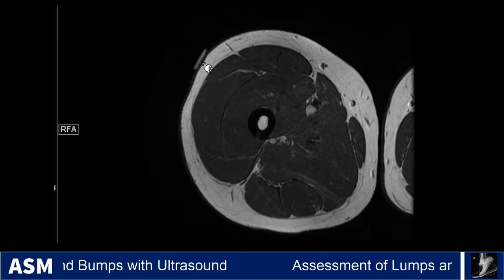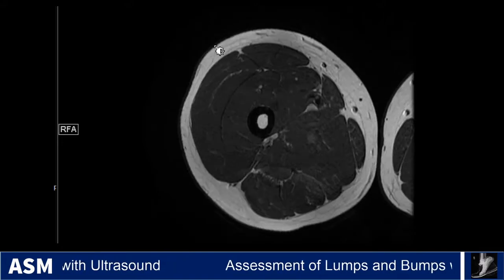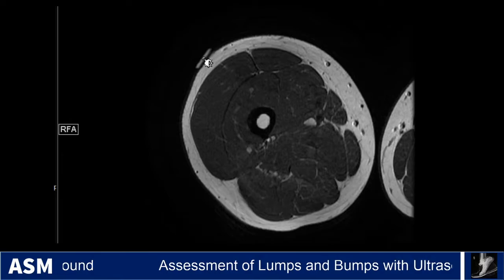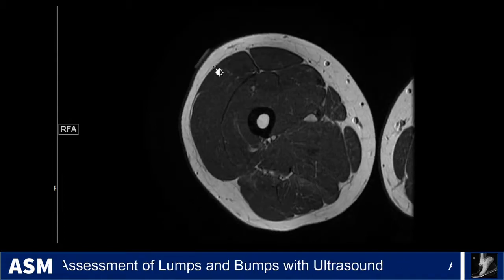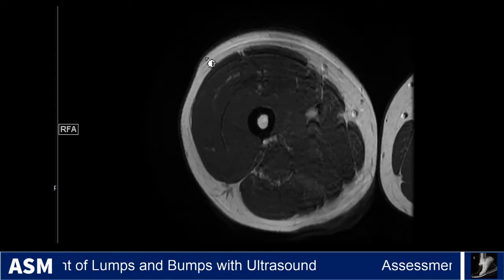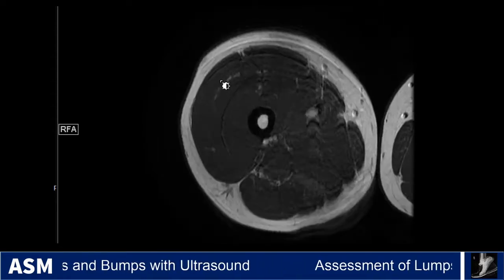So this is the first of the vitamin E markers that were placed. Proximally, the mass is located somewhere in this vicinity up to the distal marker here. And so if we look on this T1 weighted non-contrast enhanced image, we don't see any sort of aggressive appearing non-fatty mass within the superficial tissues here, nor within the underlying muscles.